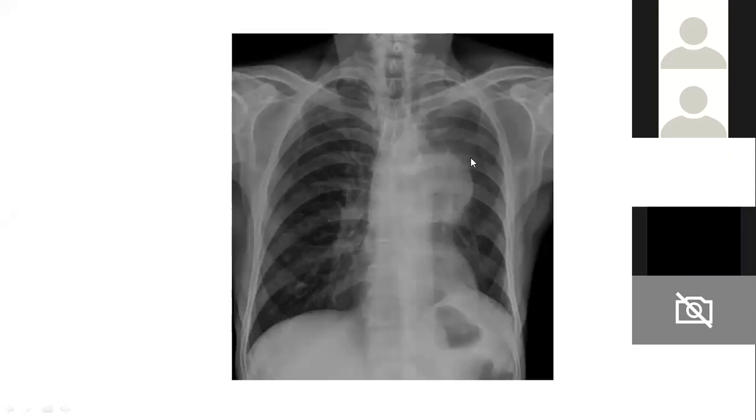One more sign that we can make out is there are a few vessels coming here, right, and they are parallel to each other, correct, at the lateral margin of the mediastinal mass. So this is what is described as a hilum convergence sign. So again, the hilum convergence sign is to differentiate between a hilar lesion, particularly pulmonary artery enlargement, and a mediastinal mass. Okay, if pulmonary artery enlargement was to take place, these vessels would have converged at the lateral margin, not be parallel like this. Here they are parallel.